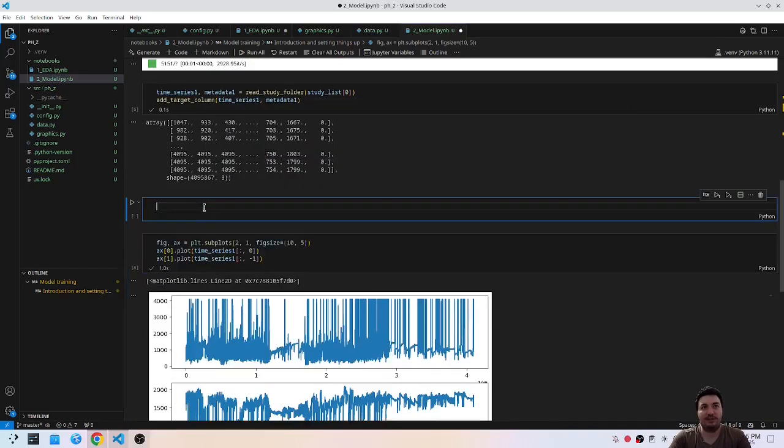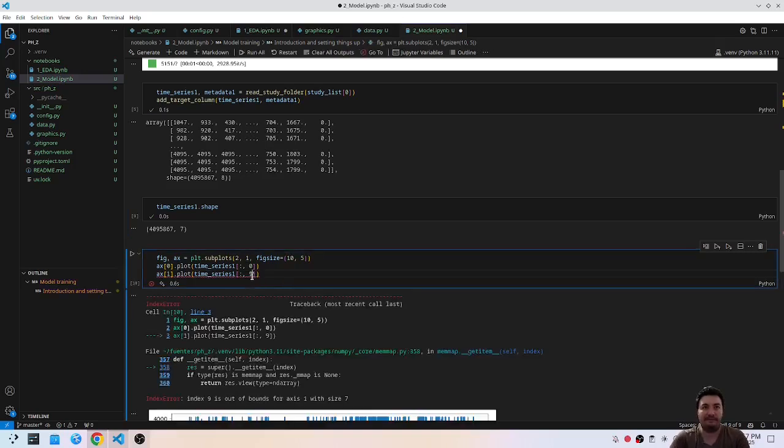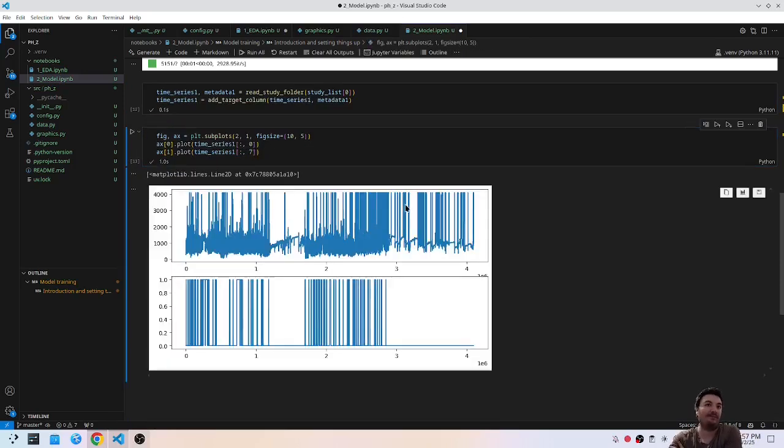I misput the shape, right? Shape. No, shape the 0 is right. No. Okay, I'm a complete idiot. Okay, so we have this.